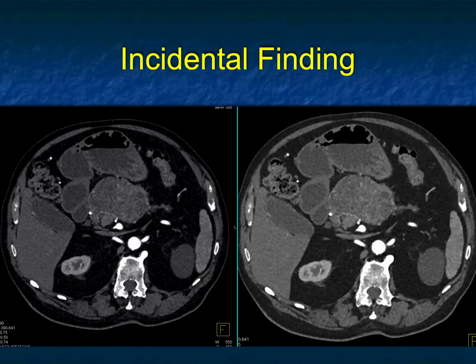Okay, we're nearing the end. Curtains away. Cystic mass body of pancreas, septations, atrophic distal gland, no common duct dilatation. This is the appearance. It doesn't look like an MCN. MCNs are more cystic with larger cysts and septations. Doesn't look like an IPMN. It's not a lymphoepithelial cyst. This is a classic appearance of a serous cystadenoma.